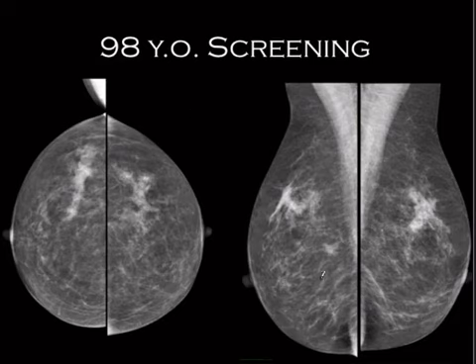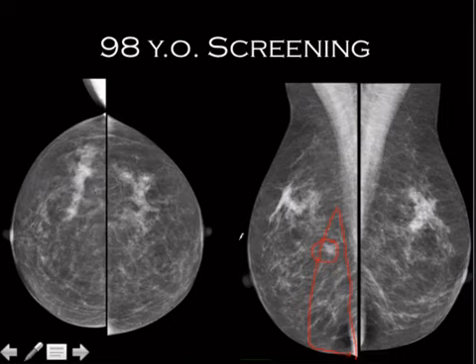So there's a finding. So this posterior, this part right here, this is where most of the breast cancers you tend to end up catching them. And back in here also, things don't belong back there. So there is a finding here, not necessarily seeing it on the CC. So this is a situation where we have our MLO only.